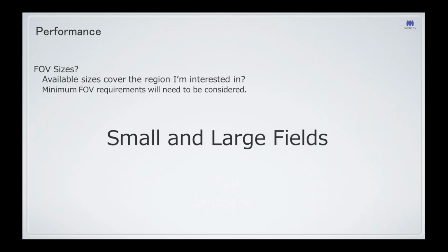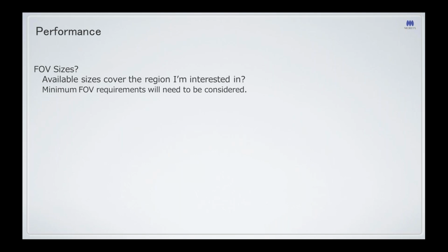These are sizes that, of course, we provide, but many manufacturers will do so. So make sure you get one that matches what you need. Preferably small and large fields, because again, you don't always want to go large. You may want to go small to, again, focus in on the particular problem that you suspect, and also to reduce the amount of time it's going to take you to sit in front of the computer and actually diagnose images. If you're only looking at a 4x4, you can diagnose very quickly and do your treatment plan rather quickly and easily.